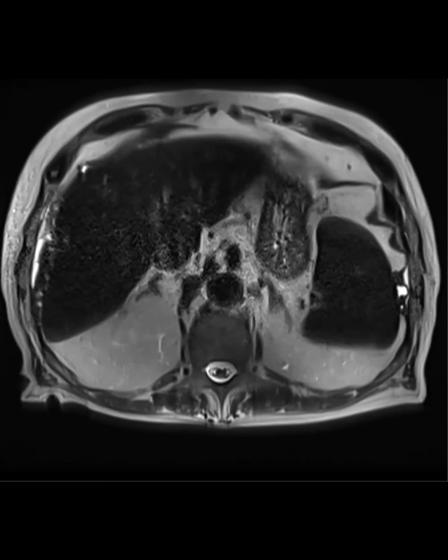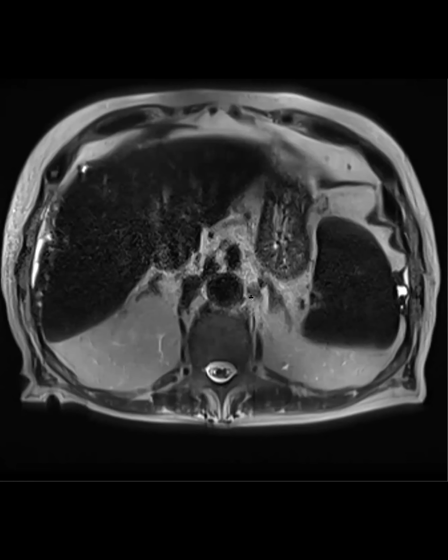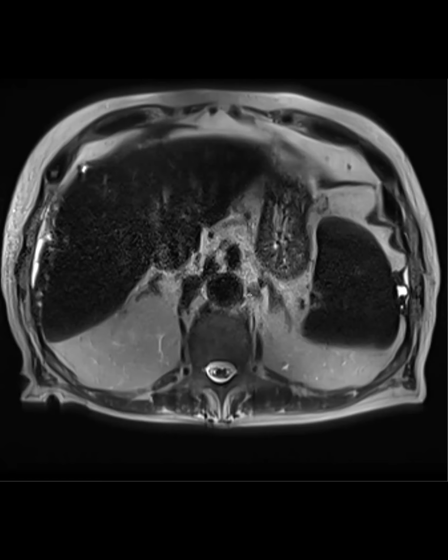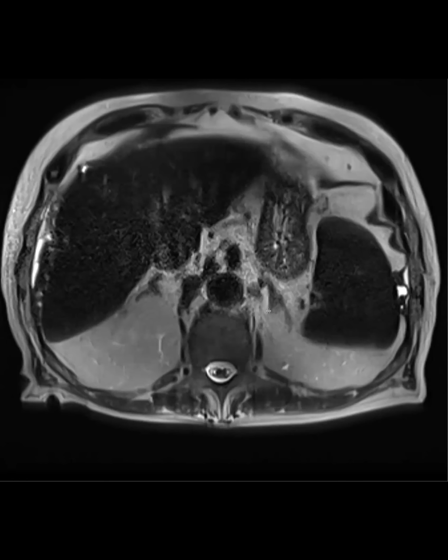You can see it's between the adrenal gland and usually the aorta or diaphragm here. It's bilateral, but here's the one on the right. You can usually see it better on the left. So I'm just pointing this out because we've seen some cases of this being called a lymph node and measured, and it's not a lymph node.